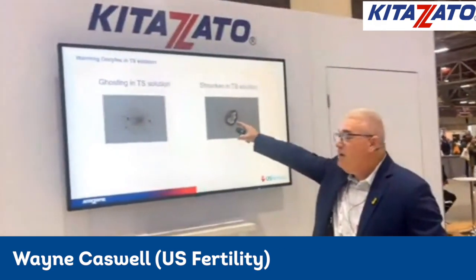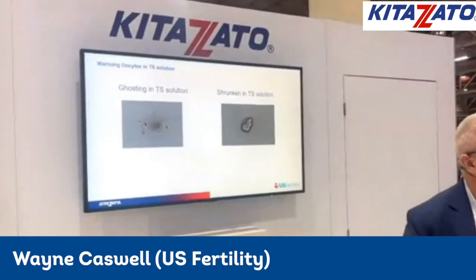Ghosting is that translucent appearance where you're like, I'm sure that's dead. Now, this is actually a good thing to see. You don't always see ghosting, but when you see it, it's a good thing. But do not move a cell that's still ghosted into your next step, the DS. Wait for the squeeze. I want to see this really good shrinkage, the marked shrinkage.